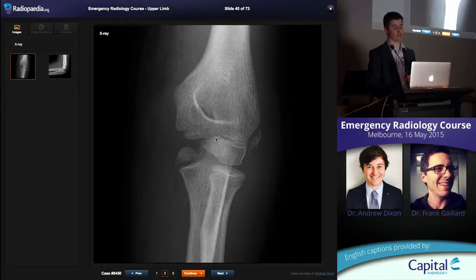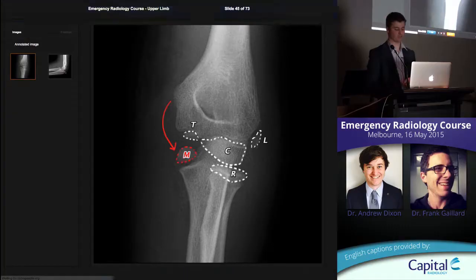We're seeing his olecranon at the back. And then we're seeing his external epicondyle over here, okay, which is often displaced a little bit like that. So the important thing to recognise is that he's got an external epicondyle, he's got a trochlea, he should have a medial, okay? And this is where it is here, displaced away into the joint. As I said earlier, that's the most common one that's going to displace away. So that's important, worth recognising.